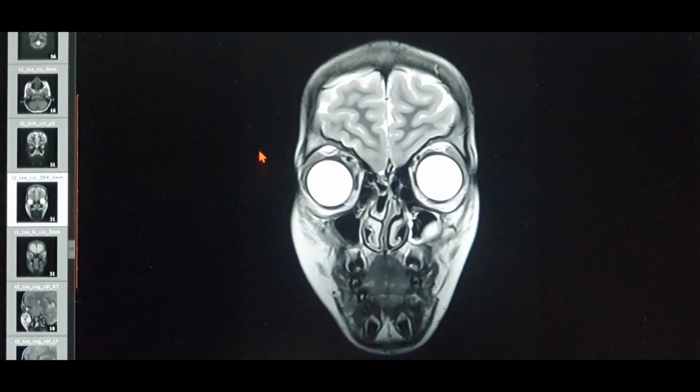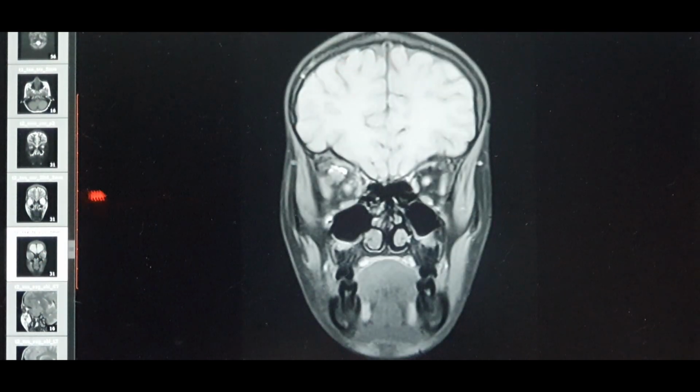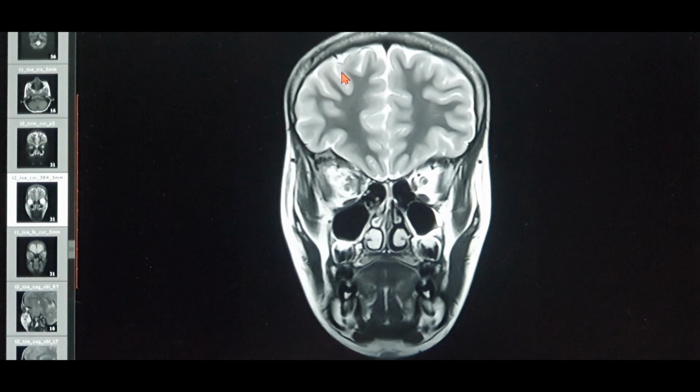So that was about the white matter, and as you can see, the cortex remains roughly gray in both scans, T1 and T2. The cortex, that is the outer part of the brain, stays grayish in both. It may be normal gray in T1, but in T2 it may be light gray, a lighter version of gray towards the brighter side. So that is the only difference in the cortex.